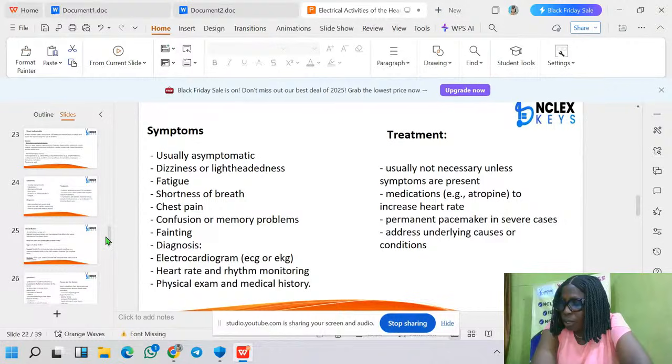I'm waiting for our responses. R to R regularity. Okay, so count the pulse of this patient for me.